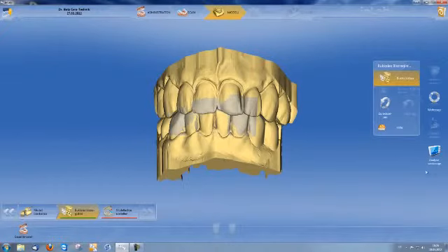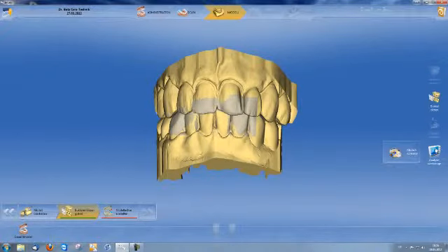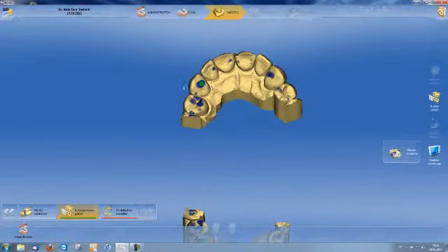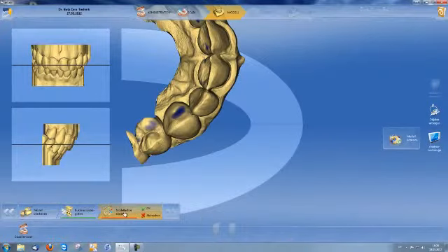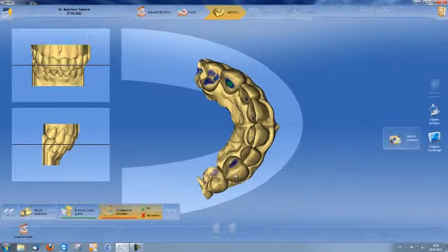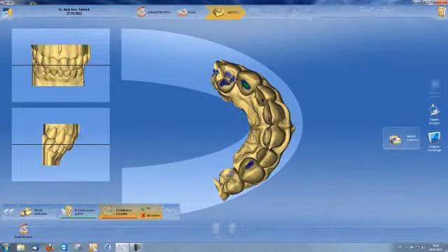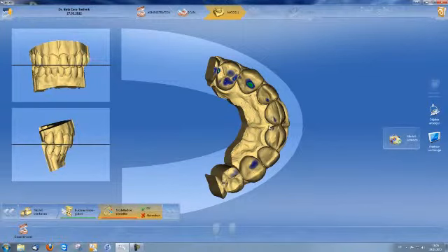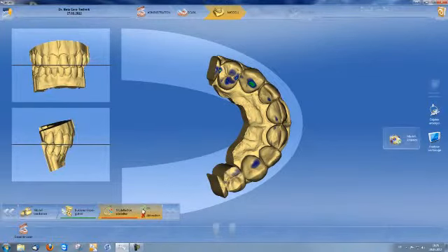I can now check my model contacts using the analysis tool and see whether these correspond to the articulator. I then go to Model Axis setting. Here, I perform the mesial and distal alignment along all three axes and also specify the midline before confirming with OK.